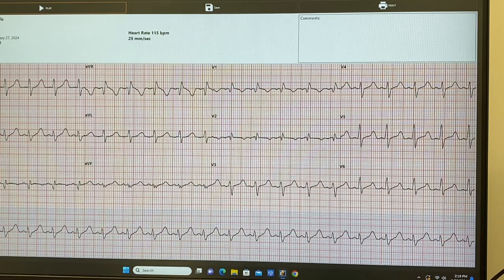There's not necessarily a problem. You will just monitor the patient. It could be benign, unless in this patient we have another issue, which is the hyperkalemia. So then, therefore, we're going to need to take care of this patient. But this is an RBBB patient with tall T waves, so probably hyperkalemia. That's a little bit advanced, but I just wanted to point out the right bundle branch block just in case you see it.